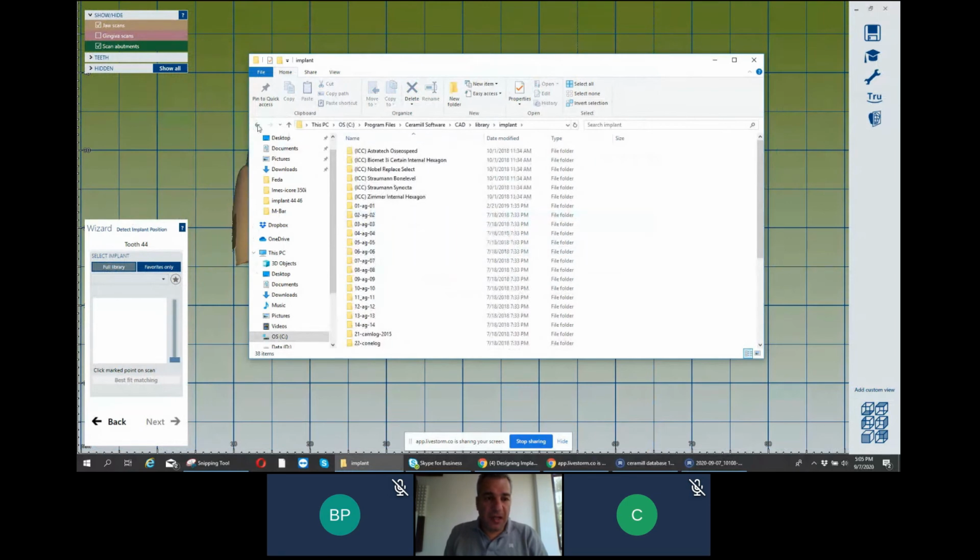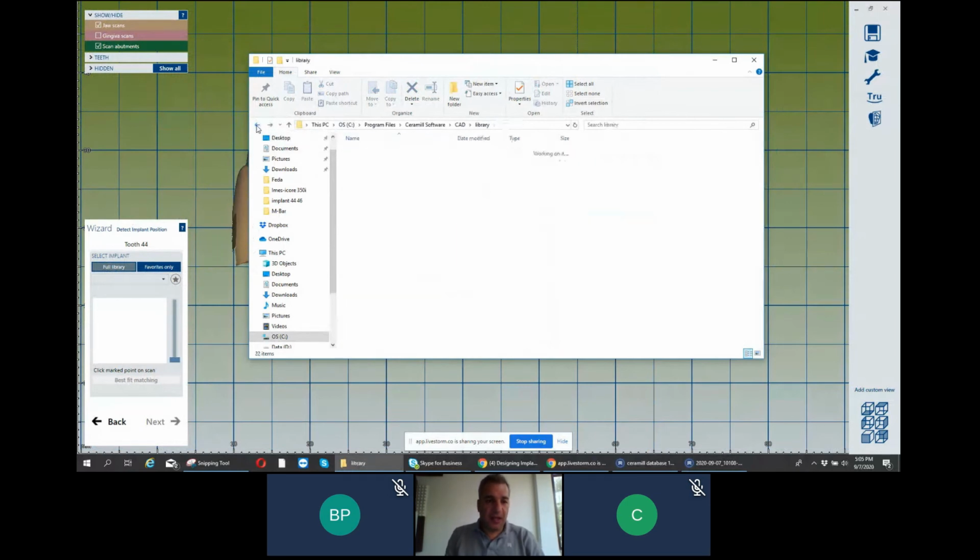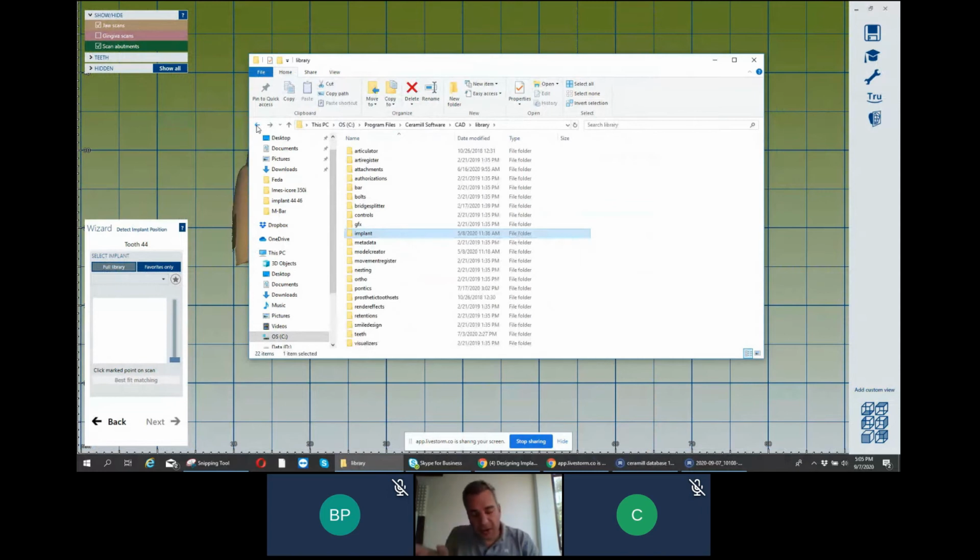If you are using an intraoral scanner and you have to create models, and you need to use inside the model the place for the analog, when you ask the company, Megagen for example, we need to use their implant library and the analog library. We should add the analog library inside of our software.